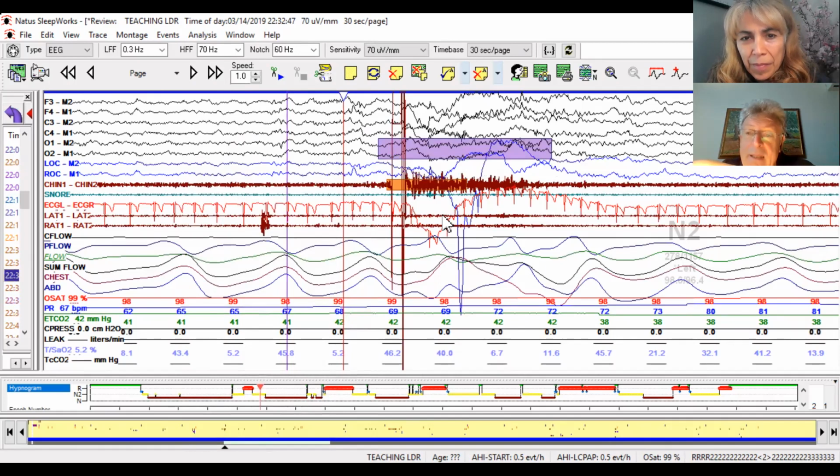Maybe this subject has moved the head or the upper limbs. There is a movement artifact on the eye channels too, and on the ECG too, but not the legs. But notwithstanding that, we can say that there was a large muscle group movement.